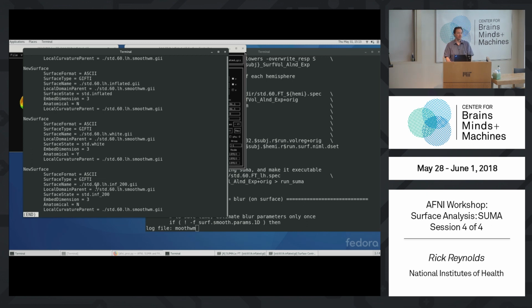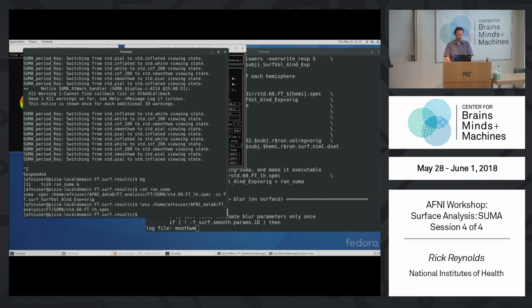This one's probably reduced to the flat. Remember, this Suma directory itself is a substantial decrease from the original Suma directory. So we wanted to keep it a little lighter for the class.